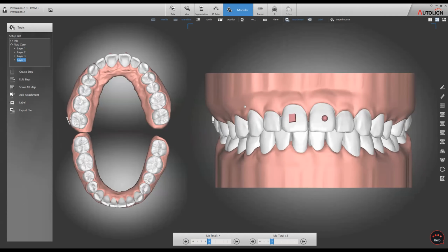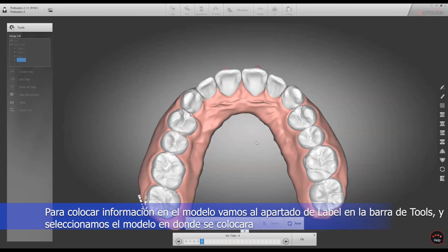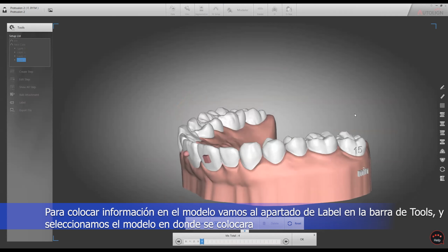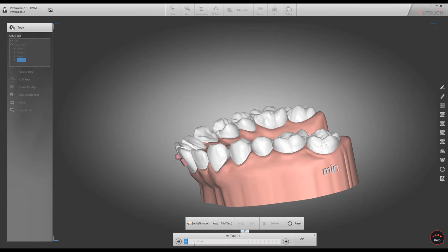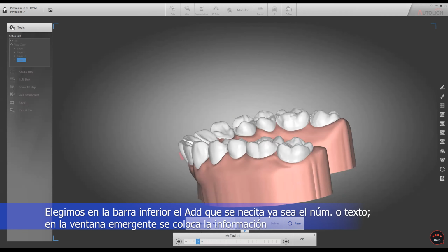And let me show you the labels. I have chosen layer 4, but if you place it on any layer, it will be automatically applied. So let me delete them. Okay. So there's a number and the text. So if you click number, you can put some text, or normally we will input nothing.